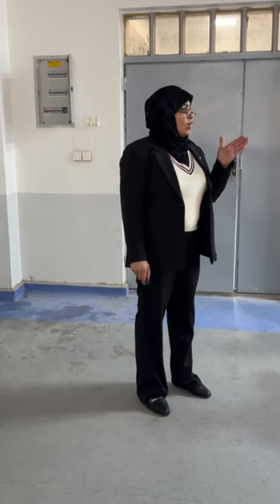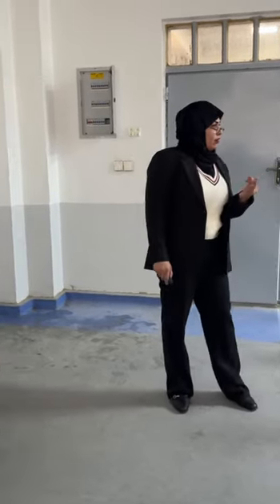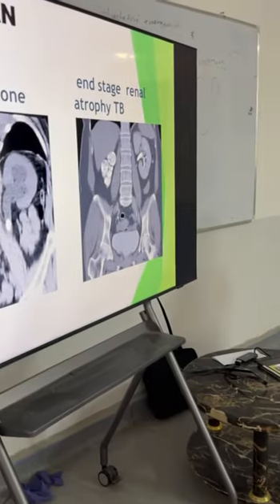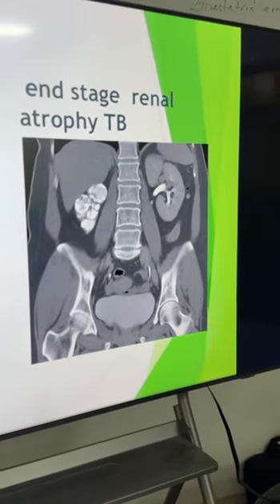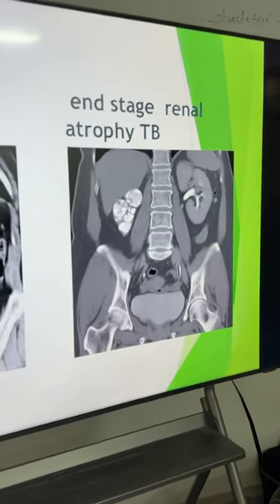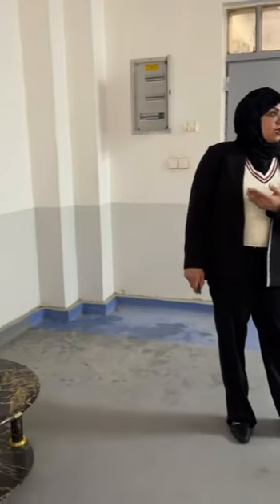Size. Do not give me the diagnosis, just describe. Small, hyperdense, irregular outline, right kidney. Where's the parenchyma? Reduction in the parenchyma. And there are multiple hyperdense structures filling the organ, the right kidney. And this is regarded as TB.